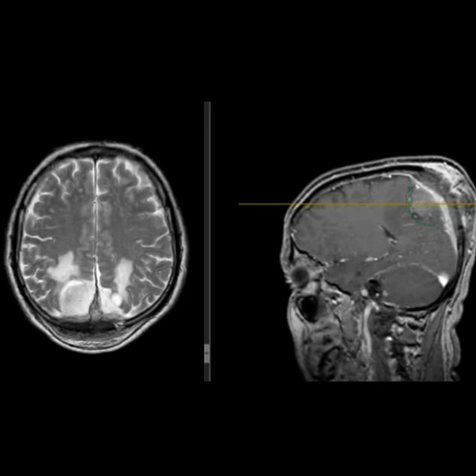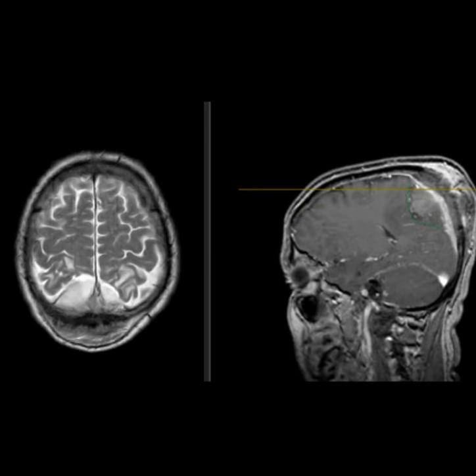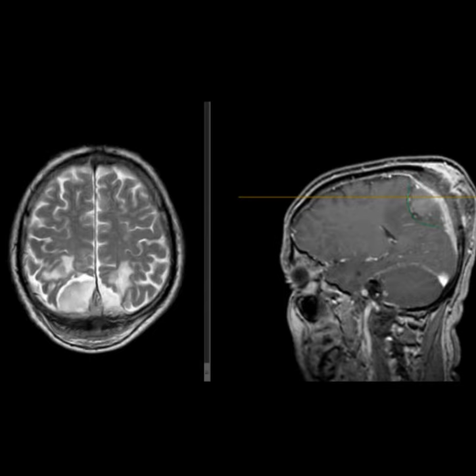Okay, this is a brain MRI of a 58-year-old male patient with scalp swelling showing an extra-axial lesion located in the posterior aspect of the intracranial component surrounding the falx cerebri and extending through the outer and inner tables of the skull into the subcutaneous tissues.